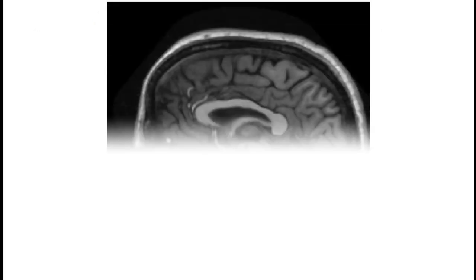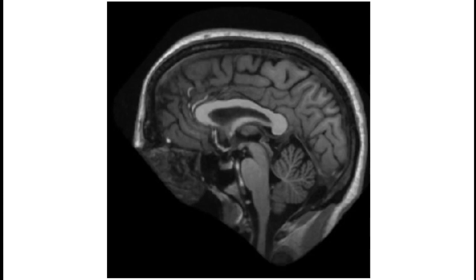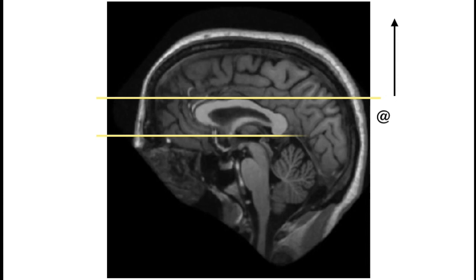So using those two specifically as landmarks, we're going to split the brain up into three parts. Those slices above the body of corpus callosum, those slices within the area of the body and the inferior aspect of the splenium of corpus callosum, which would include the basal ganglia, lateral ventricles, thalamus, and third ventricle. And those areas below it, which may include the inferior aspects of the thalamus, the hypothalamus, but mostly the brainstem, midbrain, pons, and medulla, including the cerebellum.